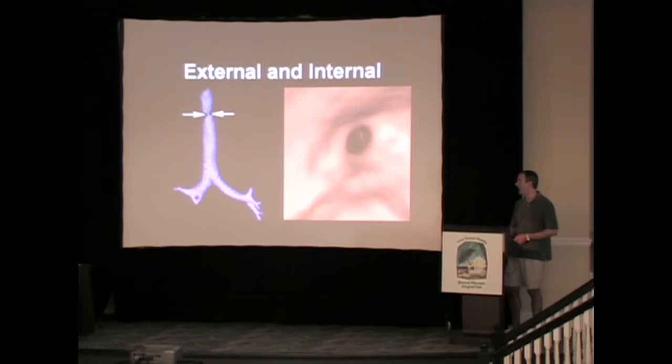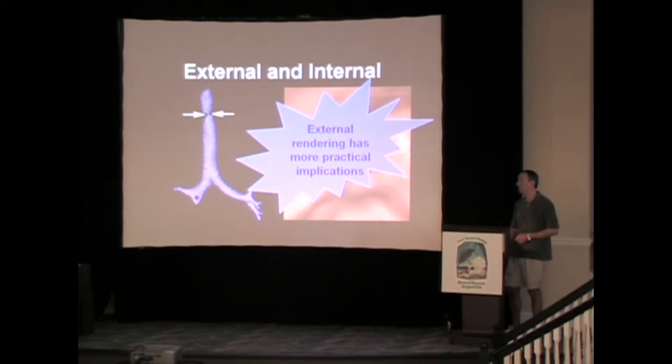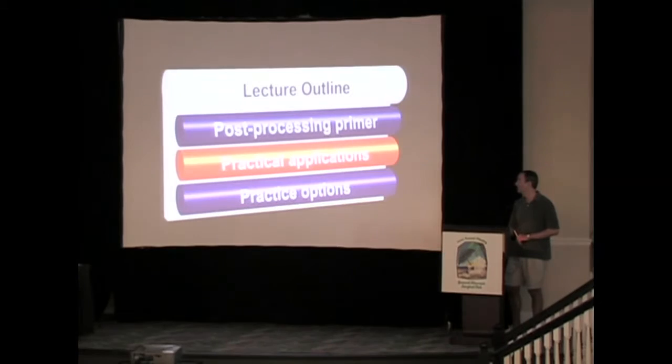Now, to date, the external rendering has been much more helpful than the virtual imaging, but certainly for things like superDimension guidance, virtual bronchoscopy is having a little bit of a renaissance or reemergence.